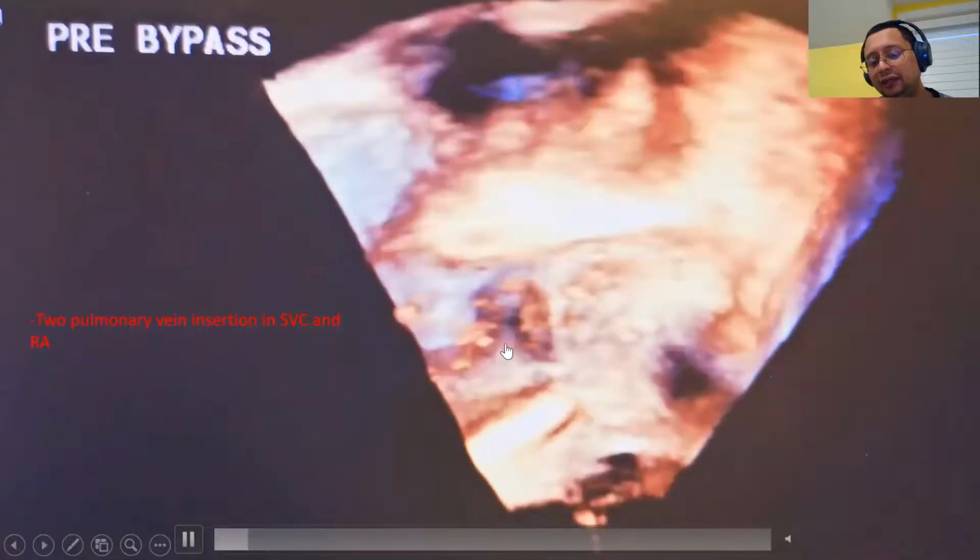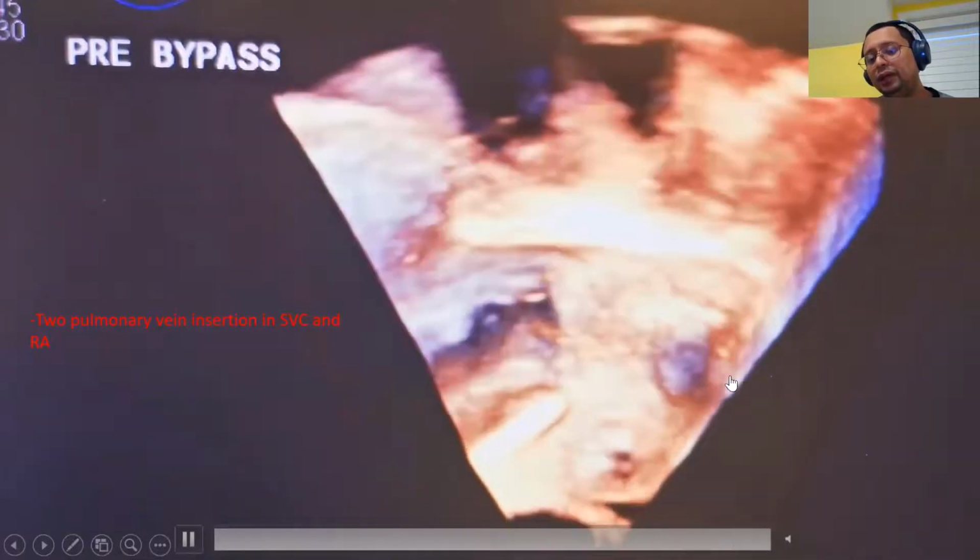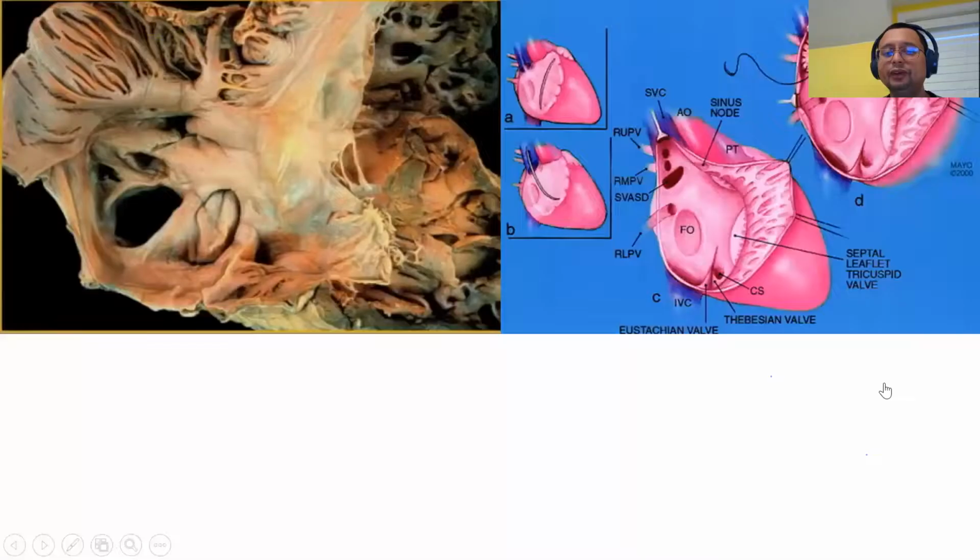That is insertion of another pulmonary vein, and this is the deficient wall between the left atrium and superior vena cava. All right, so I hope I have given you 3 cases of sinus venosus ASD. It's not easy. I myself haven't really gotten my head around it, but I hope I gave you an example. At least you have something to think about.